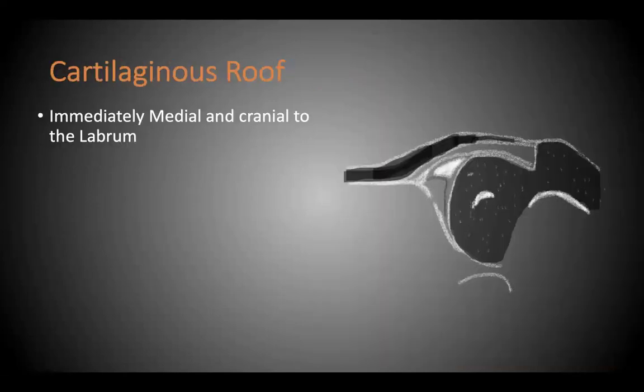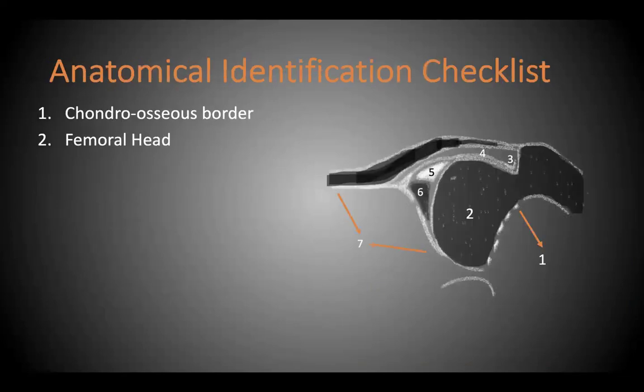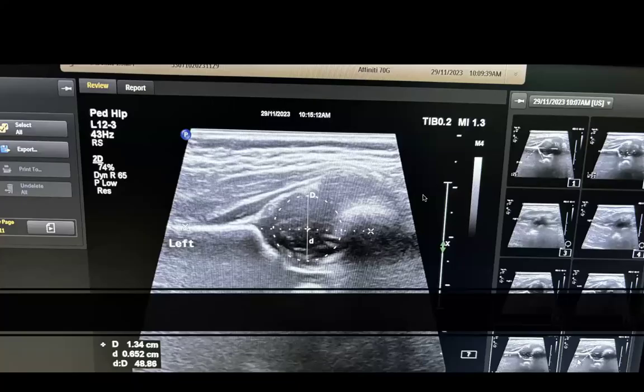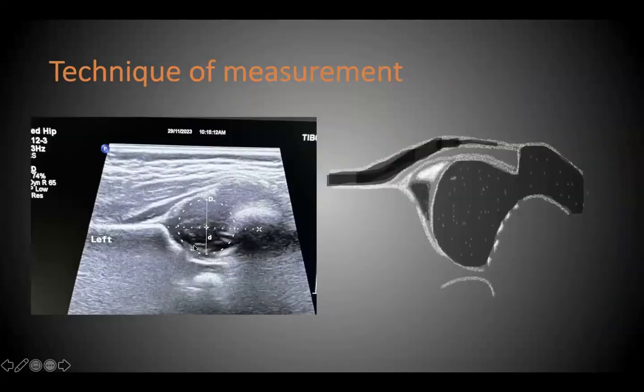I'll just show you one image before I proceed so that there is no confusion. You can see an acoustic shadow here. I hope everybody can appreciate that. You can see some bone there, and then there is a black spot, and then again you can see bone. So concavity turning to convexity, and then there is this acoustic shadow. So your turning point would be just at the lateral end of this region.